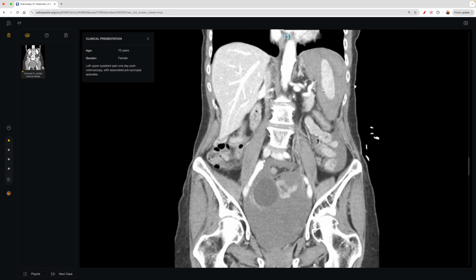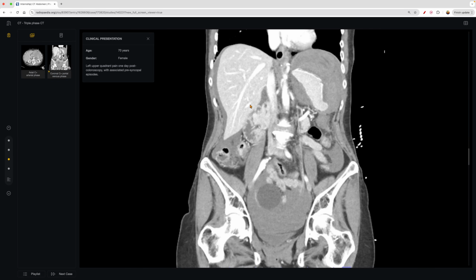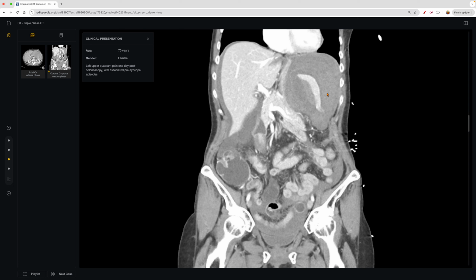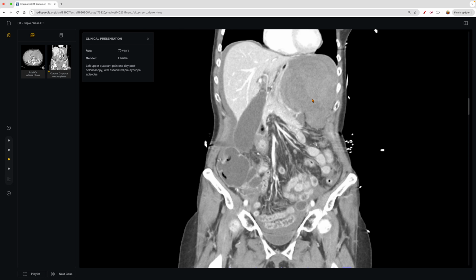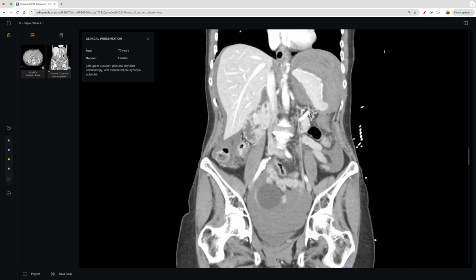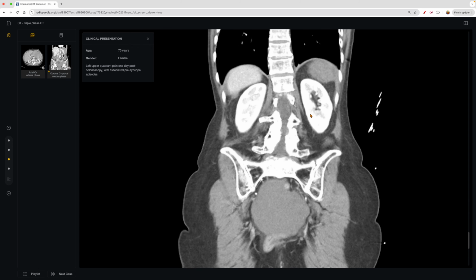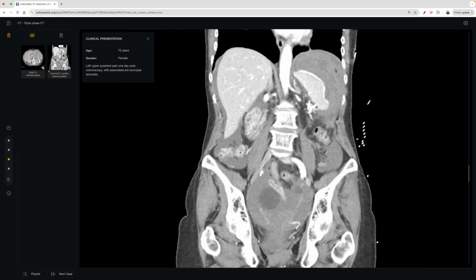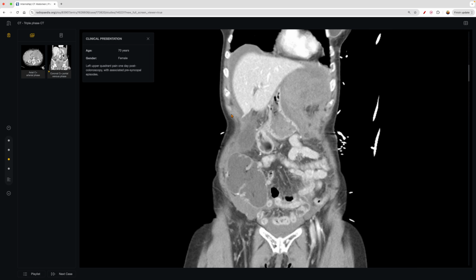And so we go to the next case. Again, let's scroll through the coronal here. I think it ends up being the same idea. And then you can see some contrast. It gets into a bit more fancier territory in terms of how you detect blood leaking from the organs here. And so nonetheless, this is a laceration that the patient ended up having. And you can see just how profuse all the fluid is from the case. And that's something to appreciate.